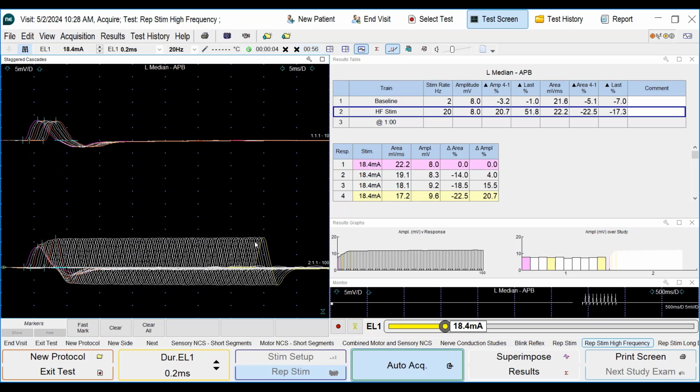How much do you want to stimulate? Well, we did a study on the firing rate of motor units and found that even at moderate force, the motor units fire under 15 Hz. So if you exercise them for 10 seconds, typically at moderate to high force, you are looking at 100 to 200 discharges. So you really don't need to stimulate for a very, very long time because the firing rates go very high only at maximal effort. So my preference is to use 20 Hz. That's at more than moderate force level contraction, and 100 stimulations works quite enough.